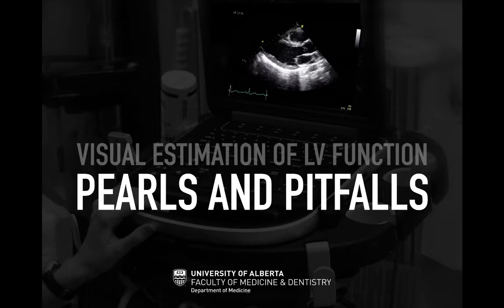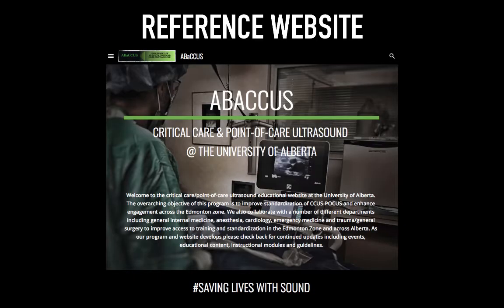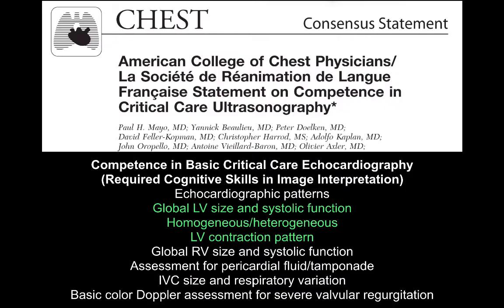This tutorial will review the pitfalls of LVEF assessment in the ICU. As always, you can refer to the Abacus website for particular high-yield points on this topic. LVEF assessment is one of the most common reasons for echocardiography in the ICU, and the ACCP accordingly highlights it as a core component of basic critical care echocardiography competency. This lecture assumes a degree of comfort in identifying different views necessary for LVEF assessment. This is covered in another tutorial of this video series.